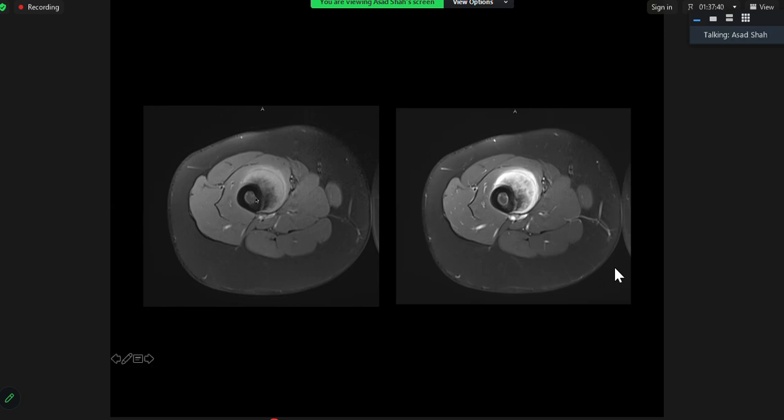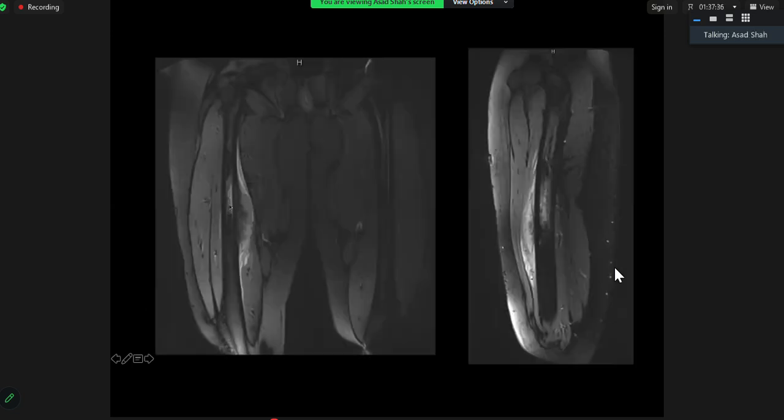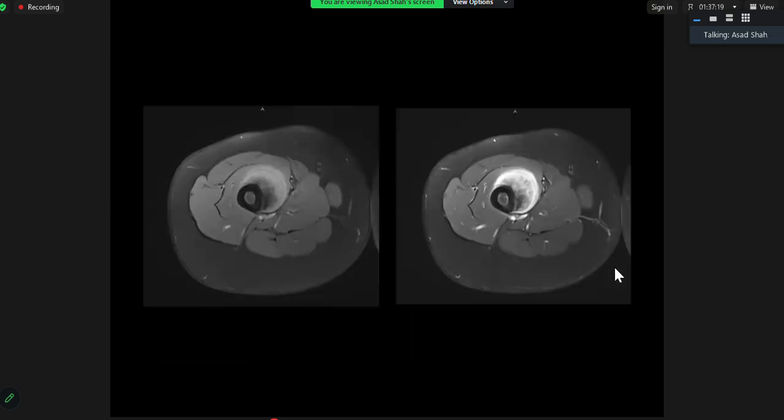But the key thing is, if you see, there is not much intramedullary happening. If we go here, there's a bit of reactive edema, probably enhancement, but the epicenter or the bulk of the tumor is on the surface. It's a surface osteosarcoma, and the commonest one in this location will be your periosteal osteosarcoma. Okay, next case now.